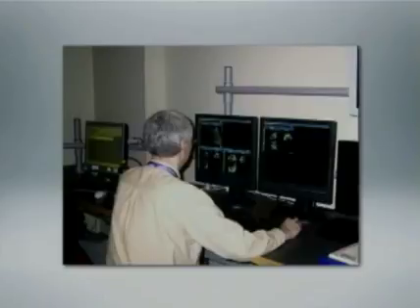The problem is that it would take time to get the raw data to this workstation. I'd have to fire it up, go through the effort of creating the images I want, and then I'd be stuck. There was no easy way to get these images back into the patient's study along with the originally acquired images. The second way of post-processing volumetric data sets is on the ultrasound machine itself.